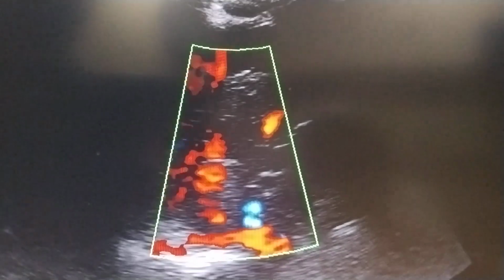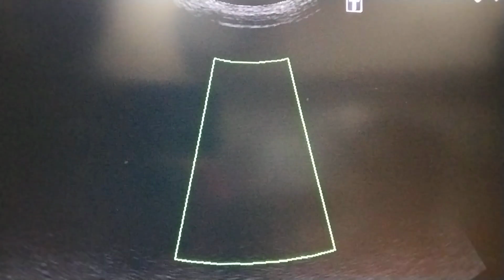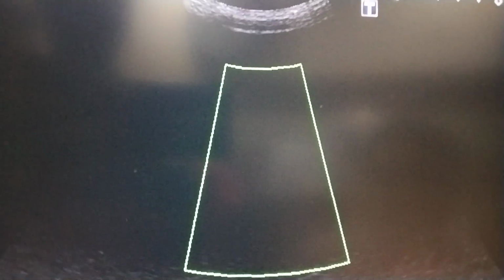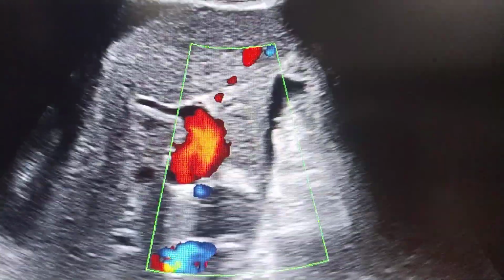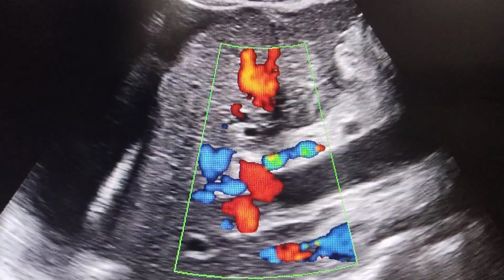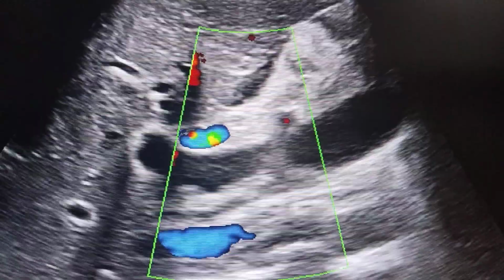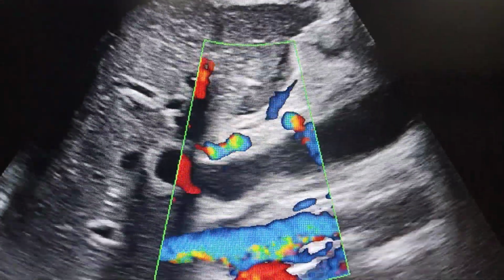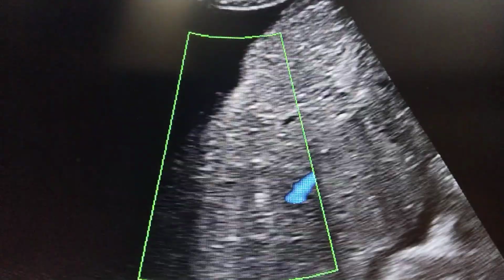So it means when the velocity is gradually decreasing, this results in portal hypertension. When the portal hypertension occurs, then there is back pressure from the portal vein to the splenic vein, and then the splenic vein is also enlarged, and also the spleen is enlarged due to the backflow of blood into the splenic vein.